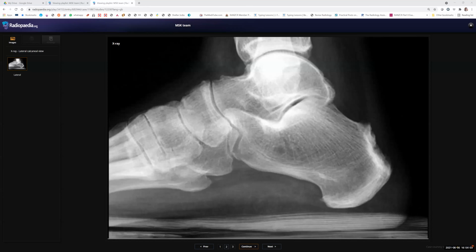You can just tell that I'll check whether this patient had any genitourinary or gastrointestinal infection in the preceding weeks. Okay. So that will add you more points. That is usually associated, 1 to 6 weeks before, the patient will usually have a gastrointestinal or genitourinary infection. So there's a small spur here. Then bone density is preserved. There is some sclerosis and erosions. So that is a reactive arthritis.